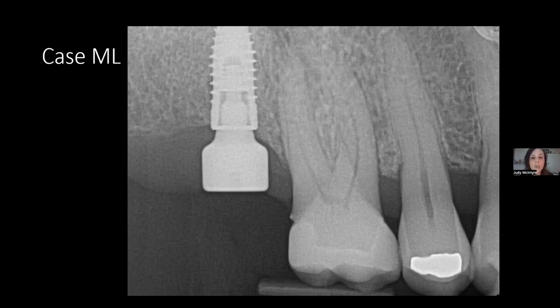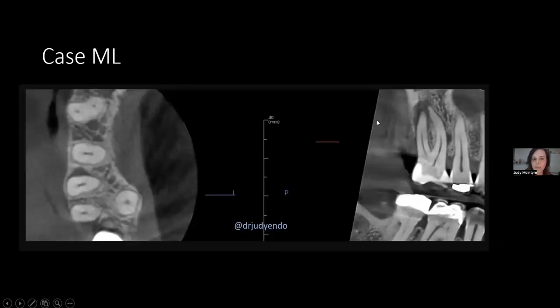This tooth is necrotic. These lucencies are because the tooth is necrotic. This is a lateral lucency surrounded by bone. Okay, so again, a Mickey Mouse ear, but not because of a crack, but because of necrosis. This is essentially a periapical lesion like this, but on the side of the tooth instead. And it's because there's a lateral canal in this tooth. So again, bone, bone, not a crack. This is a lateral lucency.